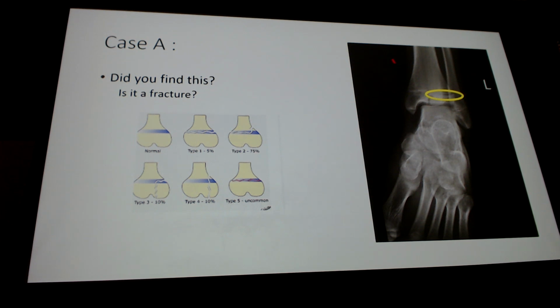This clear line right here in the epiphysis, and then the energy came out this way. Look at how wide the growth plate is there compared to the other side, right? We can use anatomy to compare things. So this is all the same fracture. It's not a new fracture, right? It's just giving you a mental mind's eye of how that Salter-Harris works. It's through the growth plate right there, and then down in here, okay?